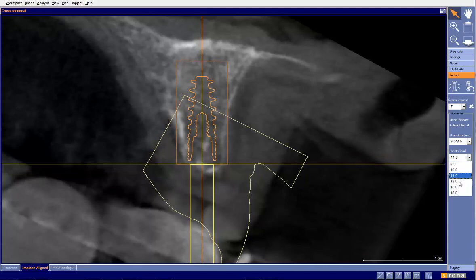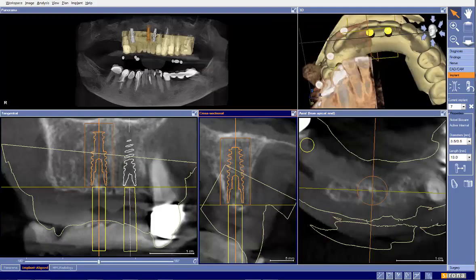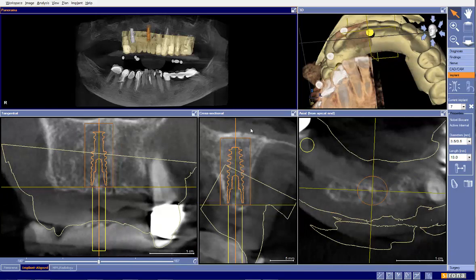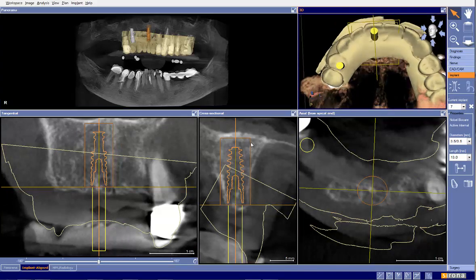And again, I would go to a 13 millimeter implant. I would take a look, does a 4.3 fit, and not bad. It's a little thin right here on the buccal, and I really don't want to mess with that buccal plate. So I'll probably go to a 3.5 there as well, but a 13 implant. So let's go ahead and take number 9 and delete it. And let's put it in site number 8. And I think right here, we now have a pretty good plan.